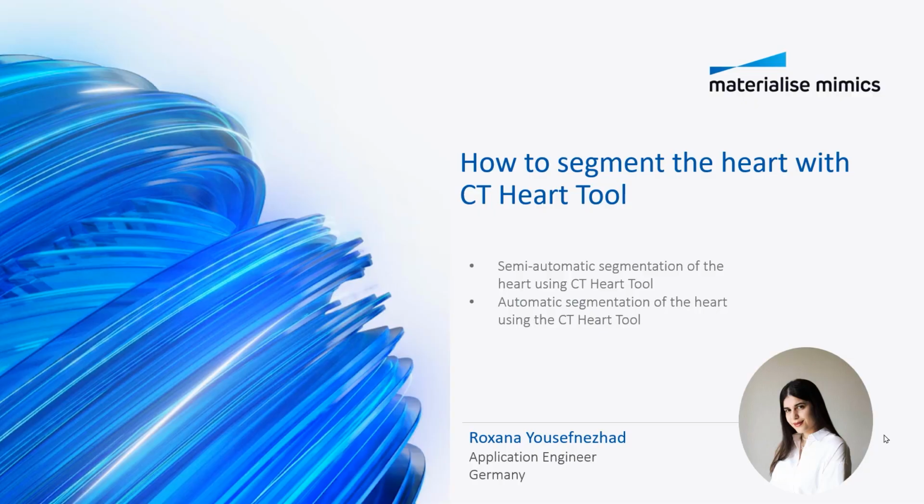Today I will be showing you how to semi-automatically and automatically segment the whole heart using our CT Heart tool. In this video, you will learn how to semi-automatically segment the heart by placing seed points on different heart structures. And then I will show you how to automatically segment the full heart using the CT Heart tool.